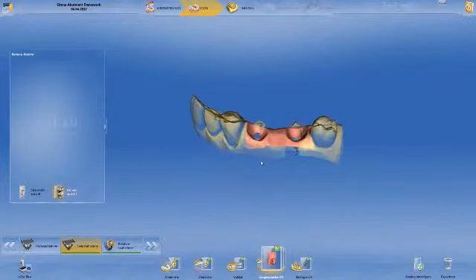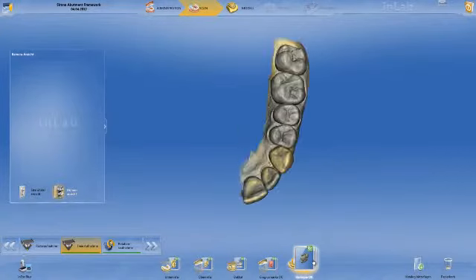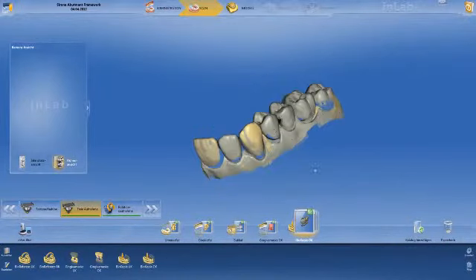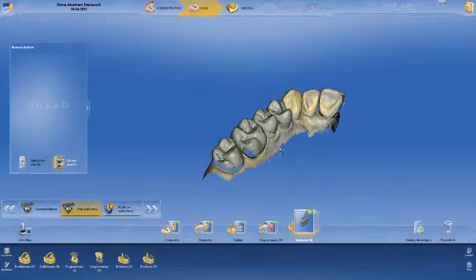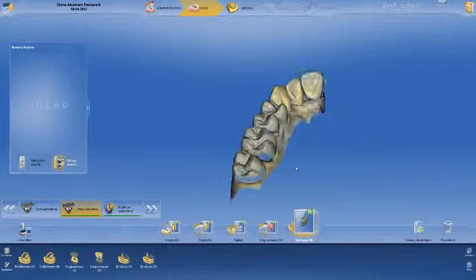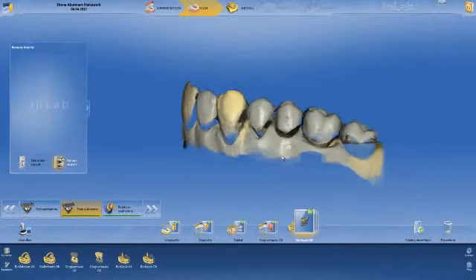In order to do justice to the available space, I also scanned a diagnostic wax-up under Add to Catalog. Biocopy upper jaw, and the software automatically correlates the image on my preparation model. This allows me to subsequently check the available space for my abutment.